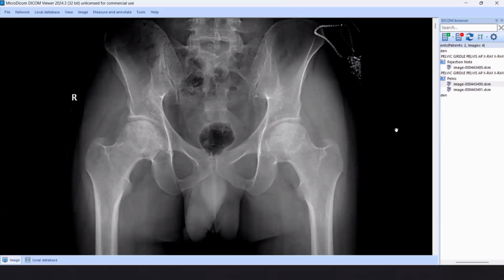Okay. Also, we should search for the cause. Do you have any evidence of the cause? How can we search for the causes of avascular necrosis of the femoral head? We should look for the vertebrae. If we saw H-shaped vertebrae, we suspect sickle cell, splenomegaly. What else? We need to check the clinical history if the patient is on steroids. Okay, you are right.